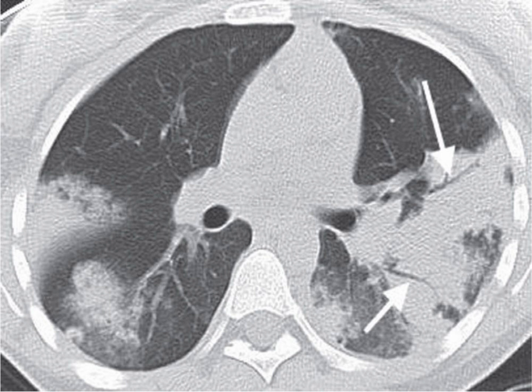The same air bronchograms and consolidation are visible on a CT scan as well, here depicted by white arrows. Those white arrows depict the air bronchograms, and they're surrounded by areas of atelectasis versus consolidation. That's the whitish area. The lungs should appear black on a CT scan as well, just like they do on an X-ray because of the presence of air.